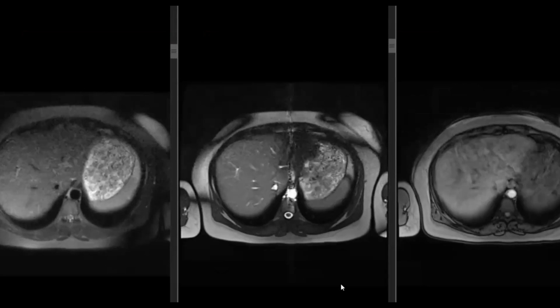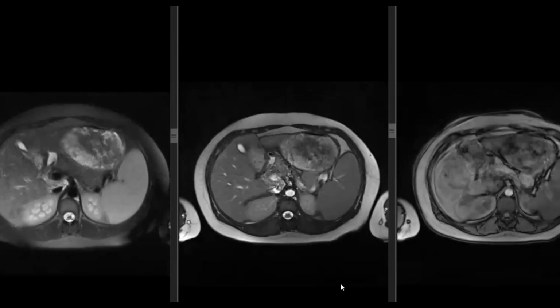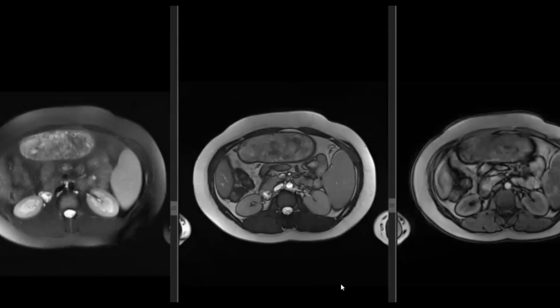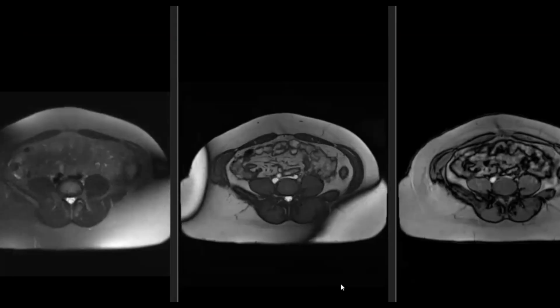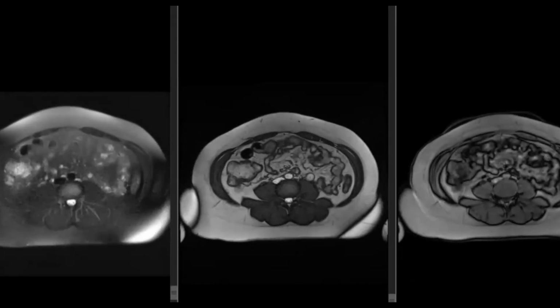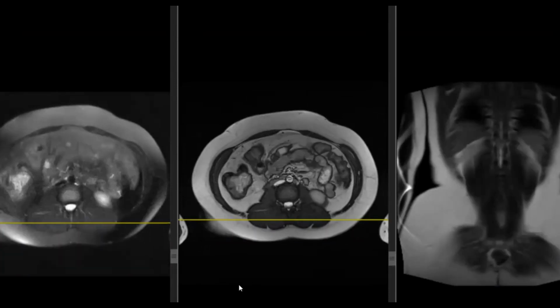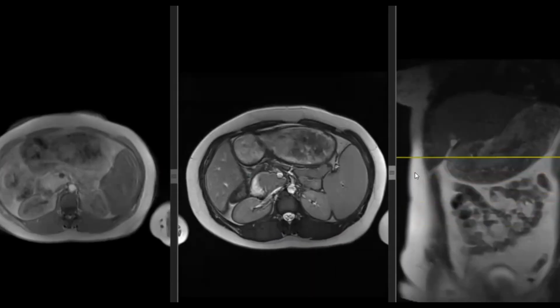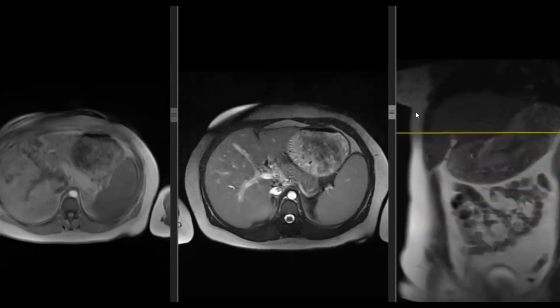This is a 30-year-old female patient with upper abdominal pain, vague, long-standing, comes and goes, and for some reason MRI was recommended. Her ultrasound was pretty much normal, not impressive, so MRI was recommended because she's still complaining. I am presented with a multi-section MRI T2 axial with coronal. The most striking abnormality is a diffusely distended stomach with mottled appearance.